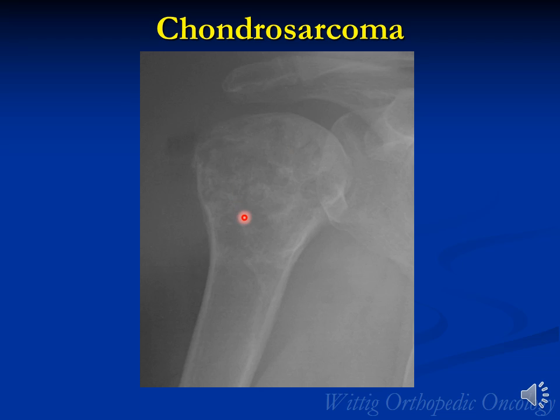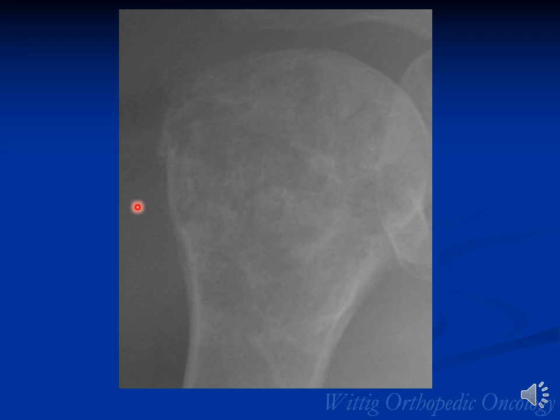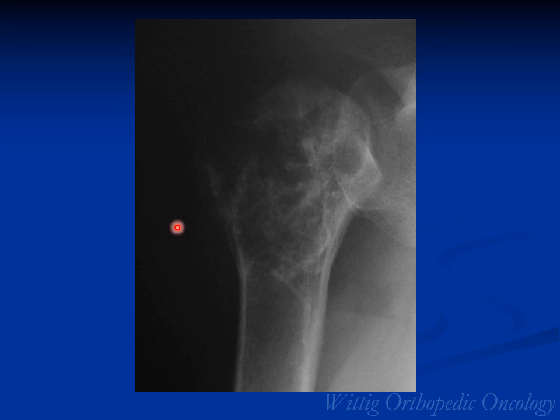This is a chondrosarcoma of the proximal humerus, and you'll see calcifications in a ring and arc-like manner in the proximal humerus. There's a pathological fracture here also. It's a closer view where you can look at the little circles, or the little rings and the arcs, putting this into likely a cartilaginous category. Again, a different internal rotation view where you can see some of the mineralization a little bit better, where you can make out the rings and the arcs throughout the proximal humerus.